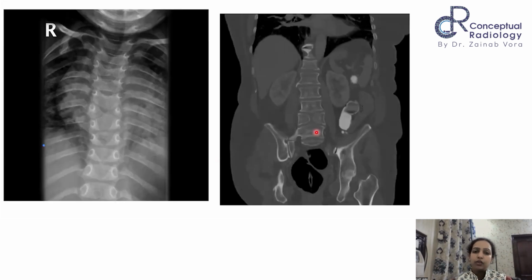Moving ahead. So now this is something else. What do you think the vertebrae is? You can spot the abnormality and please tell me what the abnormality looks like. This is an easy one, right? Very good. So that's a butterfly vertebrae.